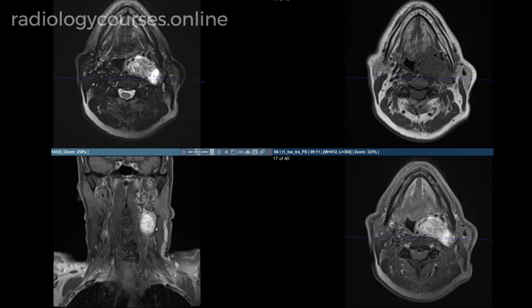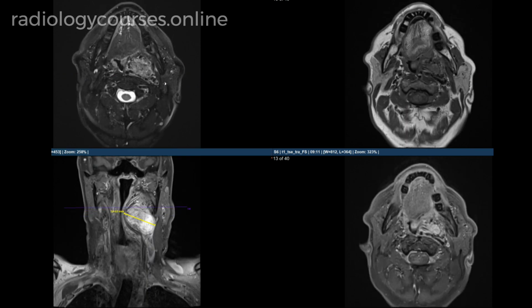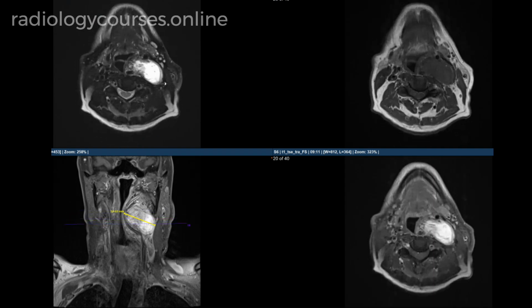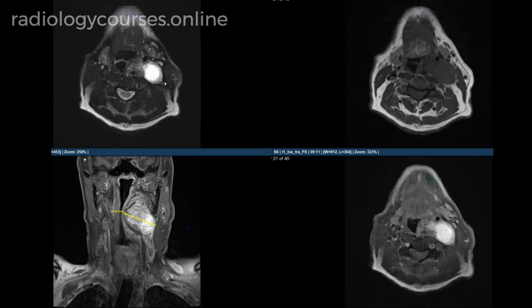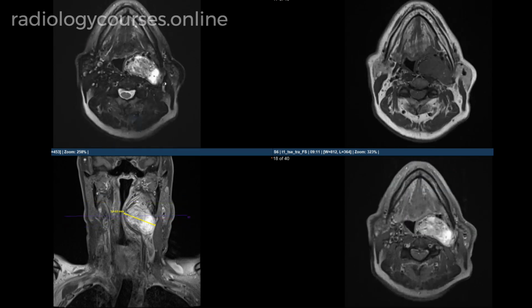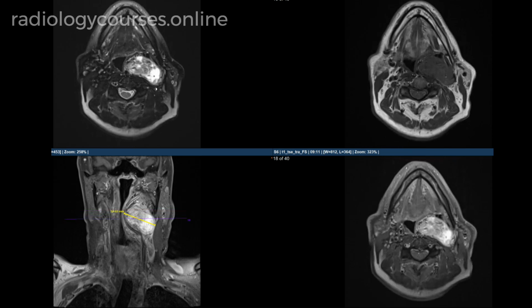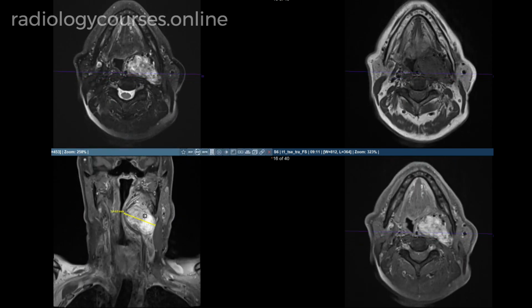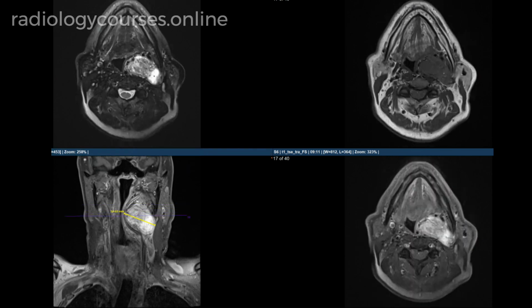Putting all these findings, the tumor is most likely to represent a carotid sheath tumor or a paraganglioma. I would not like to give any other differential at this time, and I would discuss with the ENT team to further review and discuss regarding the best course of diagnosis and treatment in the multidisciplinary team meeting. So, in summary, we have got a case of left carotid body tumor. Pathologically, it is paraganglioma.